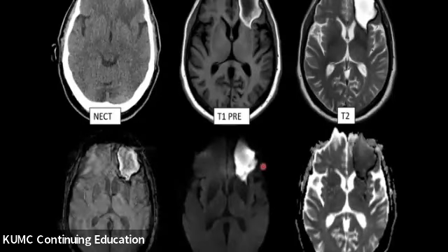So looking at a case of this, we've got a CT head, we've got some ill-defined hypodensity or isodensity in the left frontal lobe, very non-specific, but on MR, a well-defined T1 bright, T2 bright lesion. On the SWI, it's bright because it's a T2 based sequence, so this is clearly a late subacute hematoma. It's a classic appearance, but showing that it's going to be bright on the SWI, it's only this hemosiderin rim that's dark.